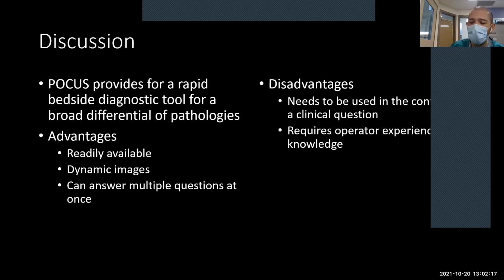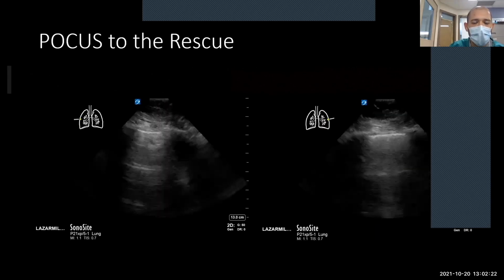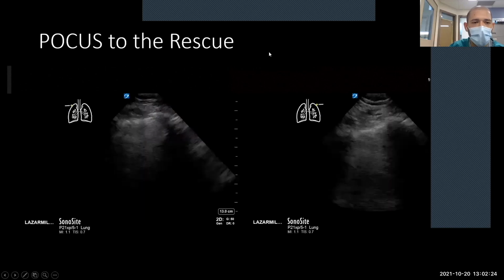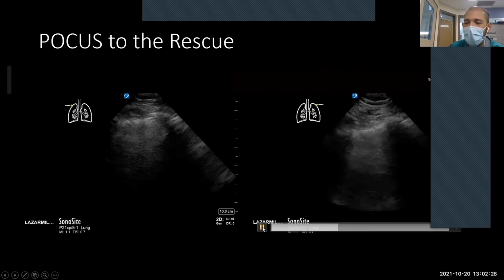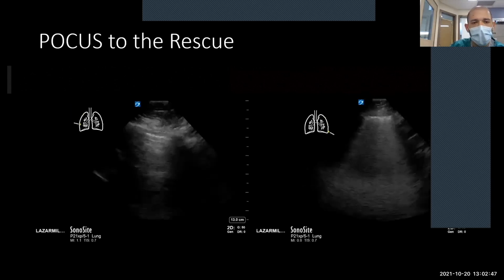So as you saw in that first set of images for the ultrasound, the point L1 and R1, when someone is ventilated on high PEEP or high APRV, you don't see a lot of lung slide on the left side either. And in the inappropriate clinical context, you may say there's a pneumothorax on the left side as well. There is not. This patient is hyperinflated and not ventilating their upper lobe at all because of the APRV. So it's important to recognize the right clinical context for the images you're taking and to use that to make your decisions.